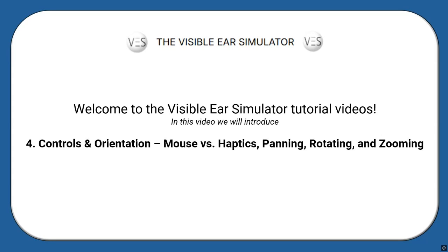Welcome to the Visible Ear Simulator tutorial videos. In this video, we will introduce controls and orientation, mouse versus haptics, panning, rotating, and zooming.